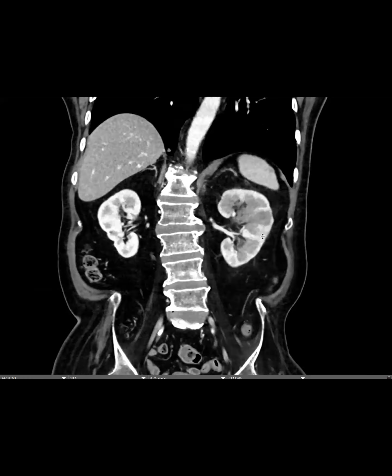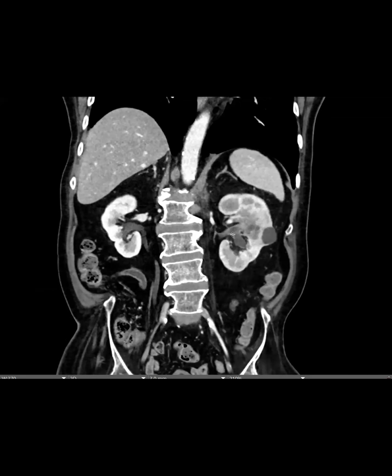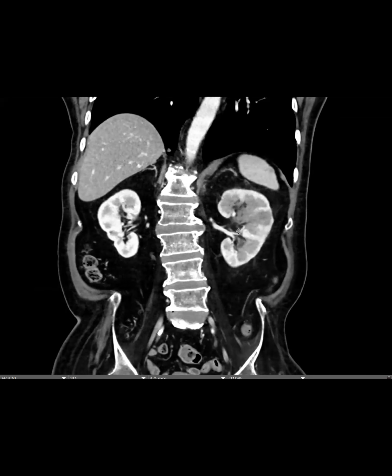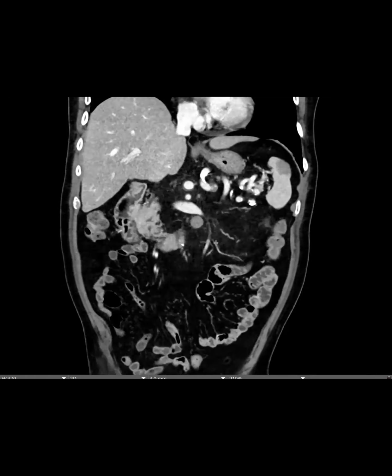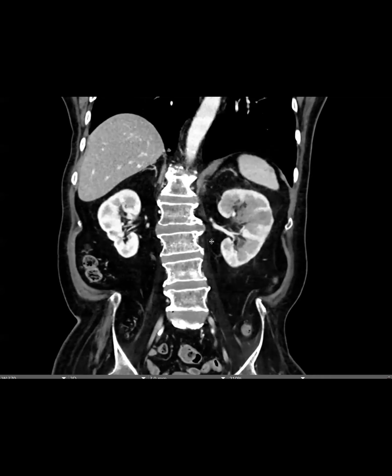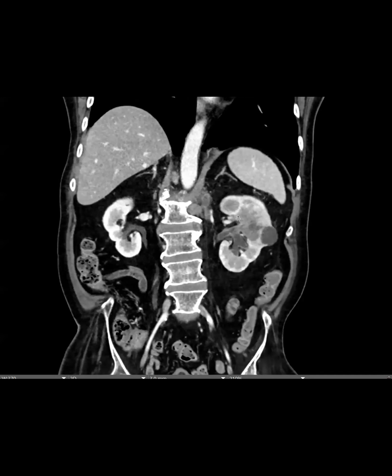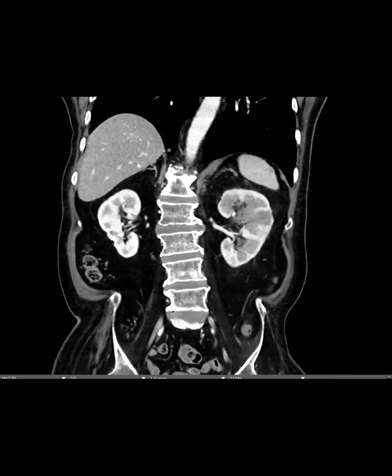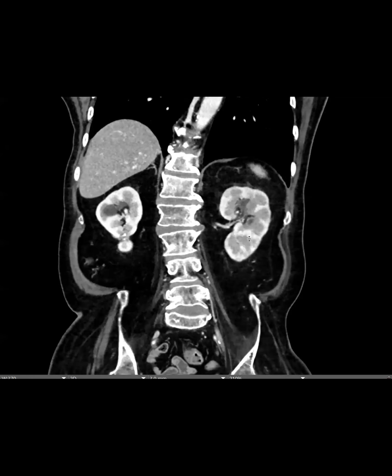So yes, that area where there was a cystic mass now has a soft tissue component invading into the collecting system and the renal sinus fat. There are necrotic nodes in the retroperitoneum, and I forget if there's renal vein invasion or not. If it's sinus fat invasion, it becomes T3, so either renal vein or sinus fat invasion makes it a T3.